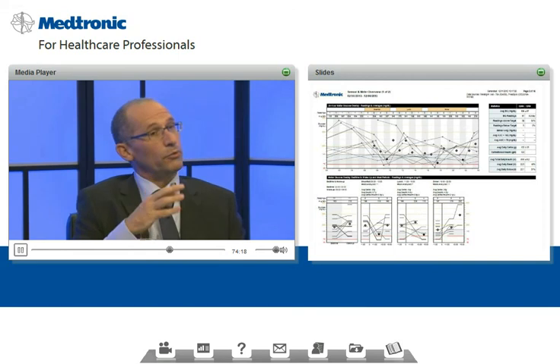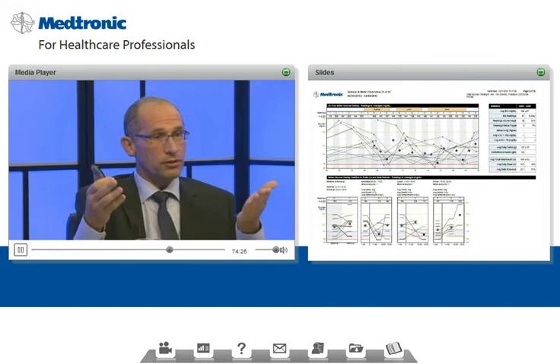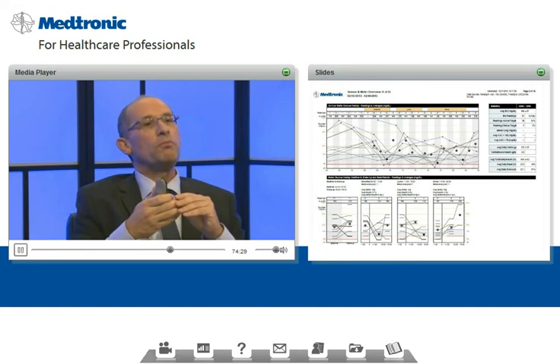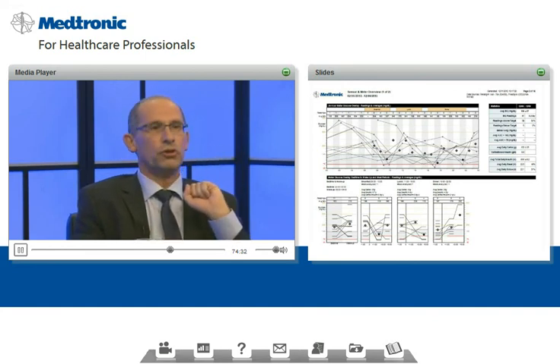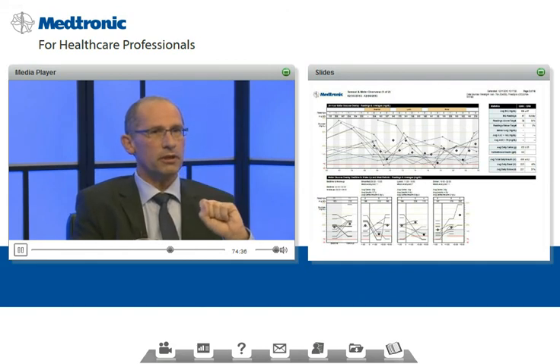This is now we have additional information. So we have the picture of the blood glucose levels in the top box. We have meal information, but we also have bolus information. So this is the overlay report, and I'll show you additional. I just want you to look at that for a couple of minutes.